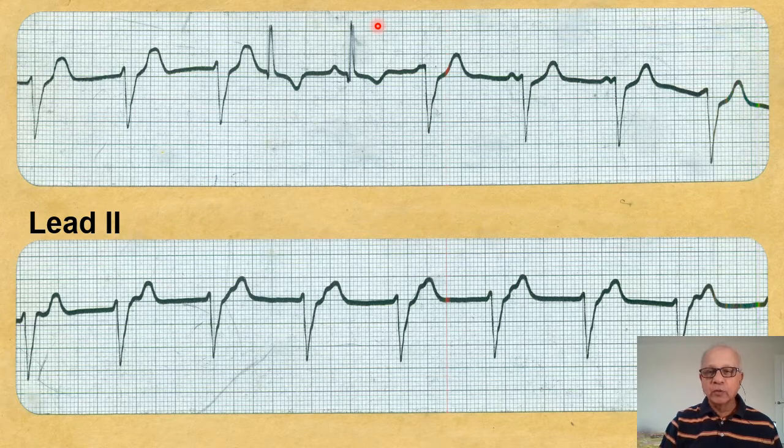So friends, I am sure you would have answered the questions correctly. The 4 questions were: what is the arrhythmia? Identify the types of QRS in the given strip. What would be the cause of arrhythmia and the underlying heart disease? And how will you treat this arrhythmia?